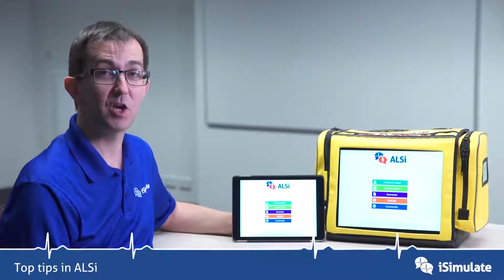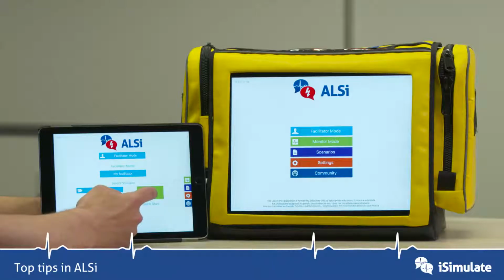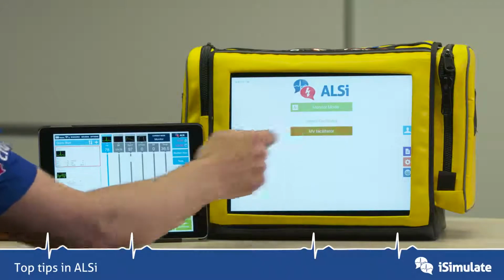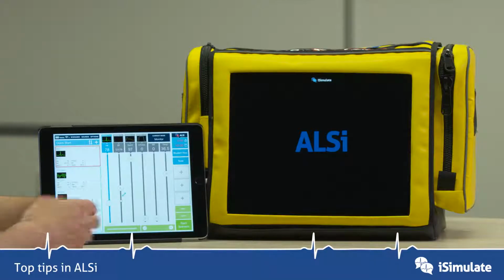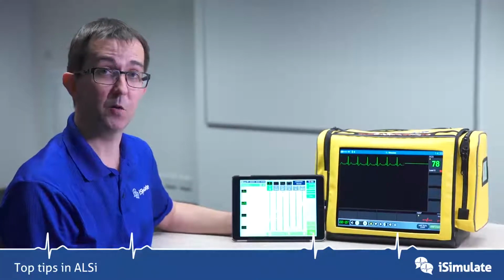So here's my 5 top tips for using ALSi. Let's start off with a scenario. Let's go to Facilitator and click on Quick Start. Go to Monitor Mode, tap on My Facilitator. And what we can do is just start the scenario, of course. And off we go.